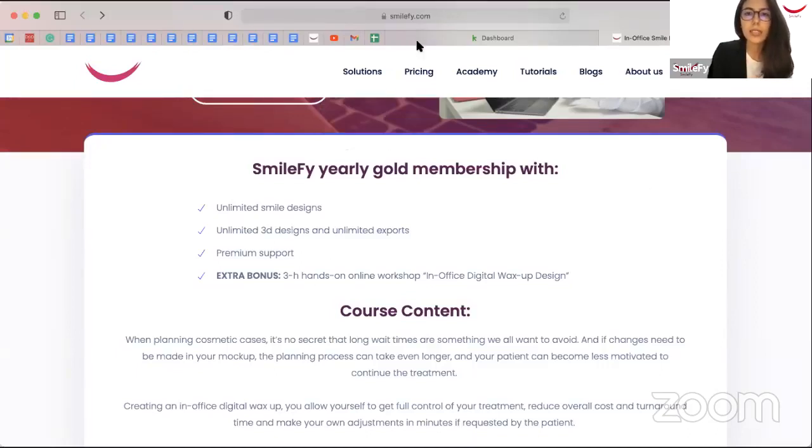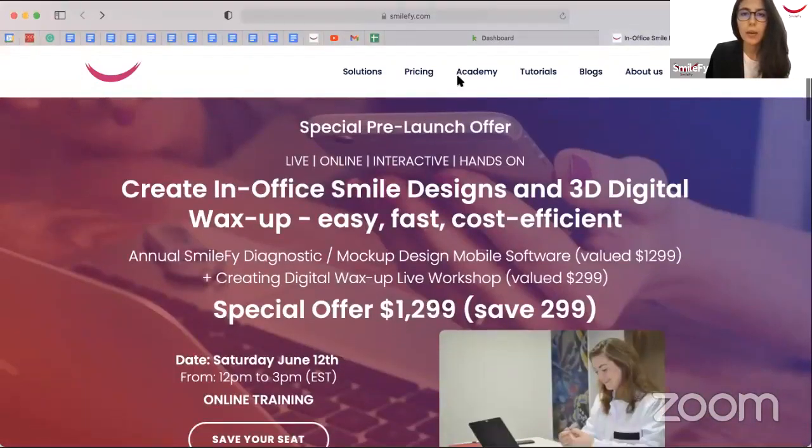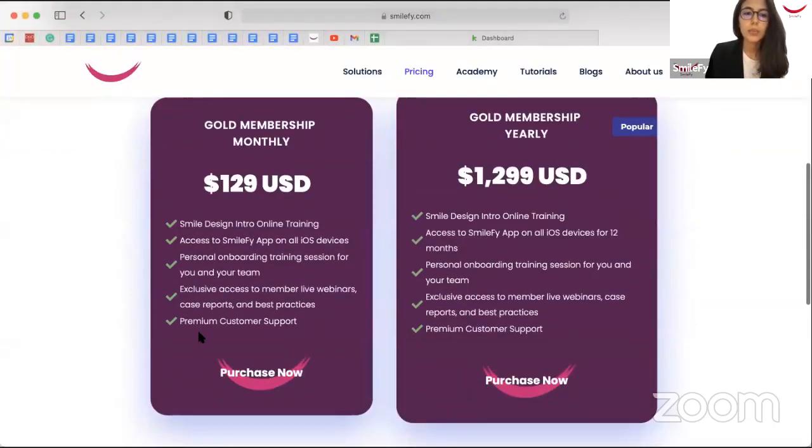So what does the... that's a good question. The annual gold membership includes 2D and 3D smile simulations. If you go here to pricing, I'm just going to show you real quick. You get the premium support for the entire year.